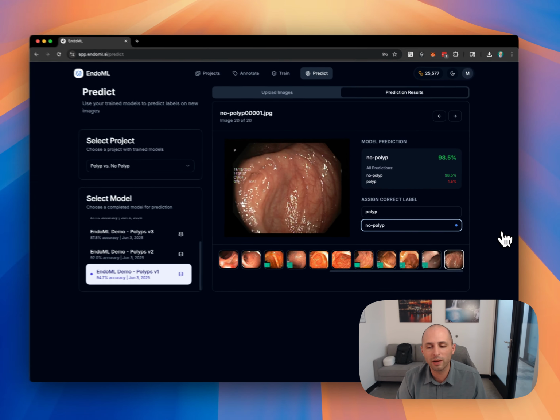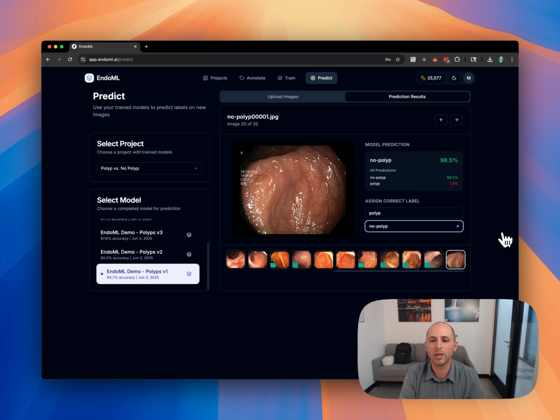There are some exciting features that we've got in the works that go beyond just image classification, but actually starting to do bounding boxes, do segmentation of objects, and then in the not too distant future, look forward to being able to use video directly in the platform beyond just still images.